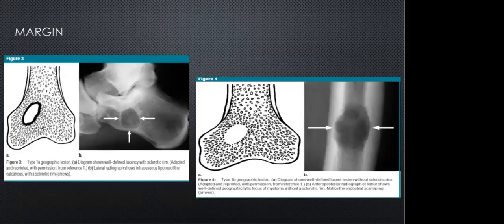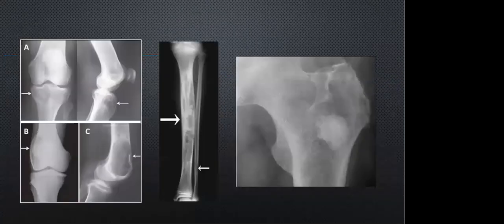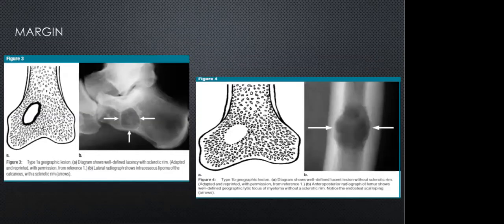Foi esse aqui. Aqui, as lesões podem ser líticas, escleróticas ou mistas, e a questão sobre a zona de transição dessa lesão. Uma lesão, por mais que seja lítica, muitas vezes assusta os médicos em geral, mas uma lesão lítica bem definida, bem delimitada, expressa características de benignidade.